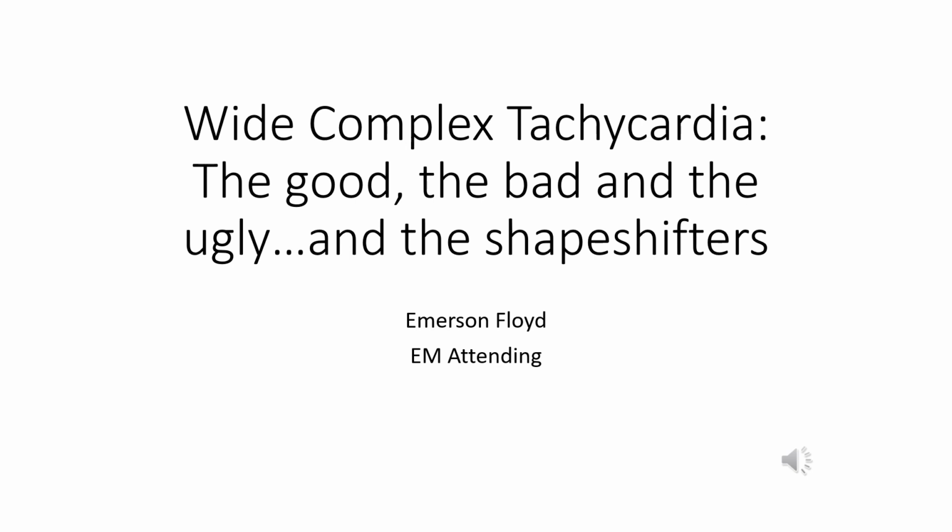Welcome. In this video, I'm going to introduce you to a rogues gallery of wide complex tachycardias and how to differentiate them. Most of this video will focus on rules for differentiating VTach from aberrant supraventricular rhythms. Think narrow complex tachycardias with a bundle branch block. But we will also be looking at some polymorphic rhythms and reiterating the principle that when it's really wide, think sodium channel blockade or hyper K.